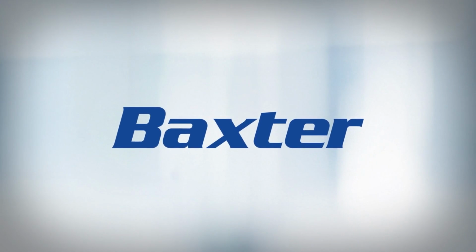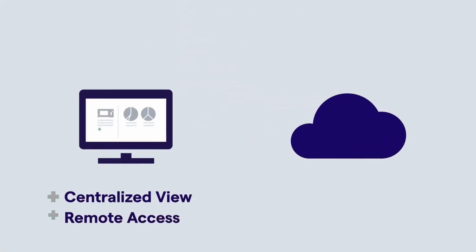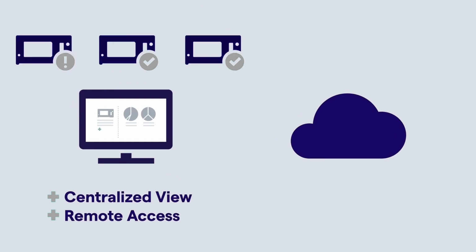Today, we'll review how to navigate remote asset management. Remote asset management is a cloud-based solution that offers a centralized view and remote access to take control of the health and well-being of your connected devices by proactively managing them from a single remote location.